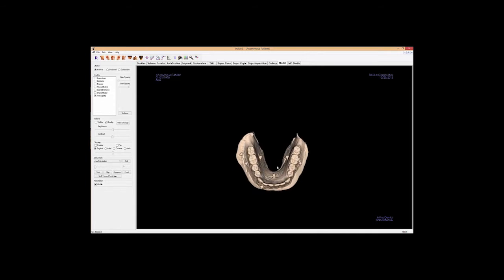And this denture was the scan that we took from the CT, and you can tell the CT data does also a very, very good job of capturing all of this. And we're not actually using any of this data for the fabrication of the guide, but it's going to be a really useful tool for us to use in terms of our prosthetic planning.